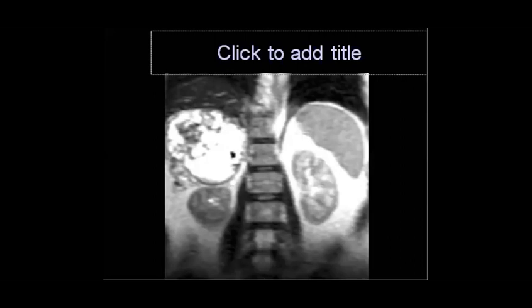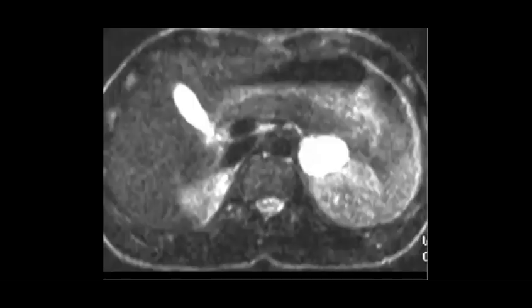And is it benign or malignant? Yes, rule of 10, Rehan, perfect. So the rule of 10: bilaterality, hereditary, extra-adrenal, and malignant in 10%. Perfect, Nirmin. Very nice. And in the MIBG, in the nuclear, it has high sensitivity for it, so you can know that it is pheochromocytoma.